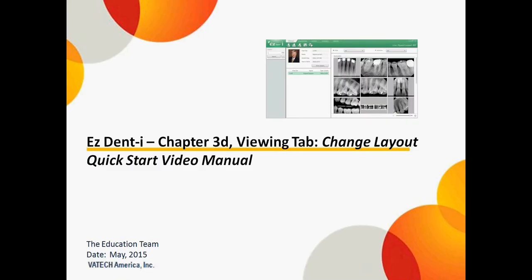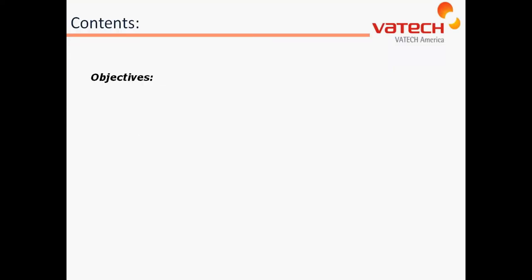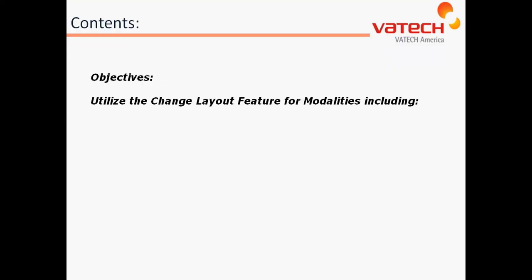The Vatech EzDent-i Quick Start Video Manual, Chapter 3D, the Viewing tab, Changing Layouts. In this presentation, the objectives will be to utilize the Change Layout feature for modalities including Panorama, Cephalometric, Intraoral Sensor, as well as Intraoral Camera.